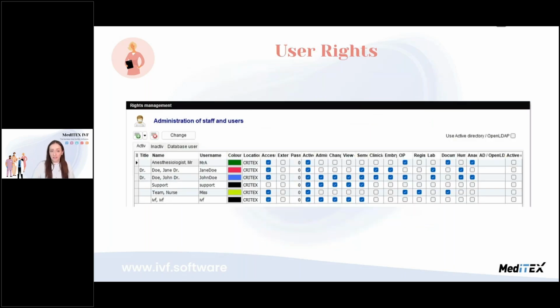The user rights are managed in MedITEX administration. This is also coming inclusive in the MedITEX IVF basic package. Here you can see all the active users. You can manage their access. You can add users. You can even see the inactive users and have a whole section in MedITEX administration in order to manage the user rights within MedITEX IVF.